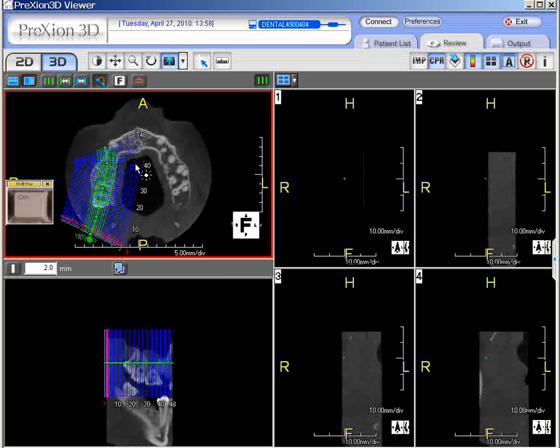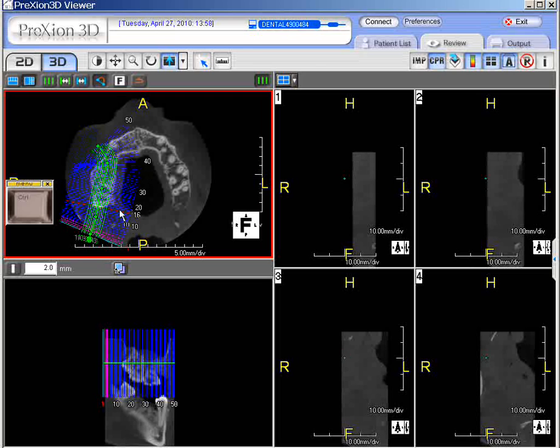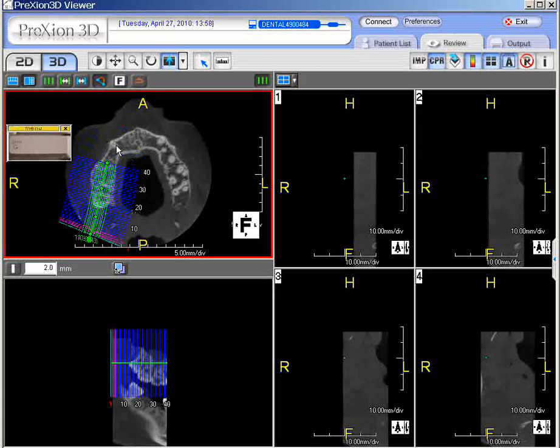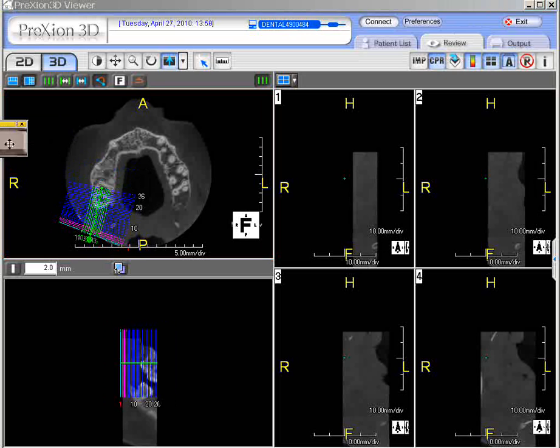Perchance, if we make a mistake, there's two ways to correct that. We can left click right on the green dot itself and move it back in position. Now, the other way of doing that is if we release our control key. Let's say we want to delete this last point. What we do instead is hold the shift key down. By holding the shift key down, we click on the point we want to delete and left click that point, and we have removed it. You can continue to do so if you wish, just by holding the shift key down and left clicking that point away.